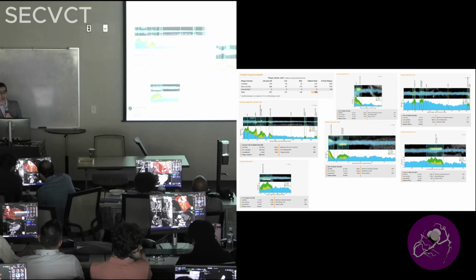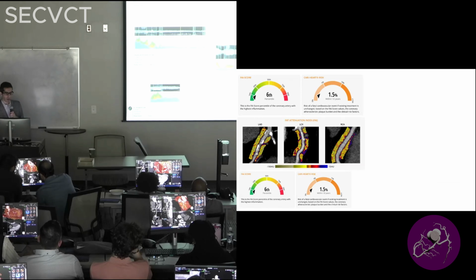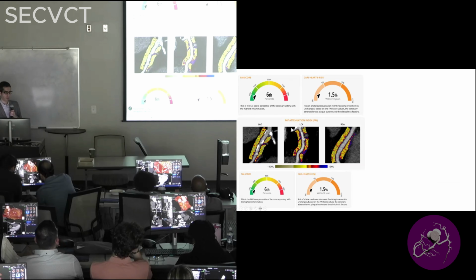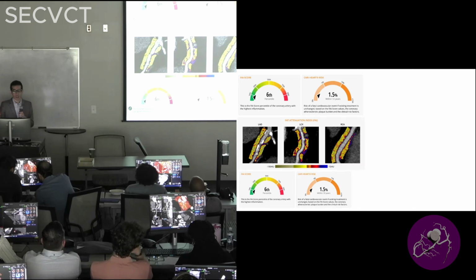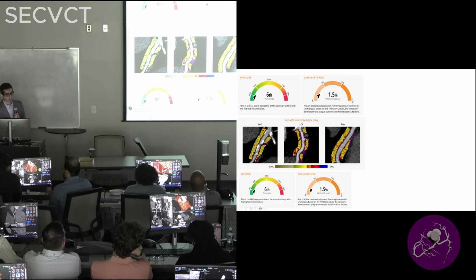The question is how much ongoing inflammation there is around the arteries. So there's a new concept, maybe now 10 years old or so, that looks at the proximal segments and tries to understand the fat surrounding the arteries of the heart, and how much that fat is more actively inflamed, so it becomes more watery, and the Hounsfield unit gets closer to zero. Again, zero is water, and on CT it's standardized. So this fat, for instance, here you can see on the color, it's more fatty. It's really less inflamed, less watery.